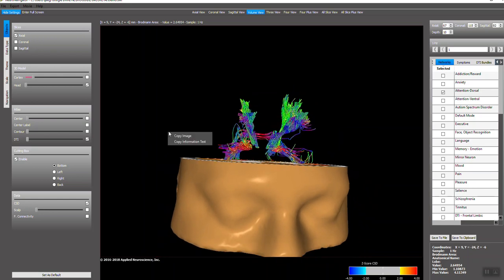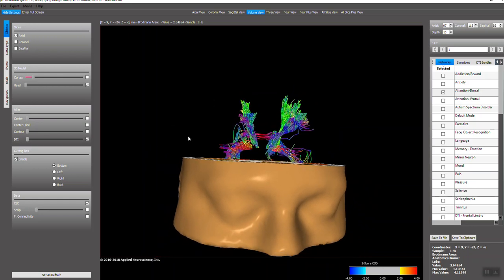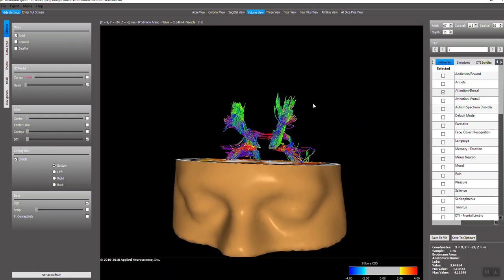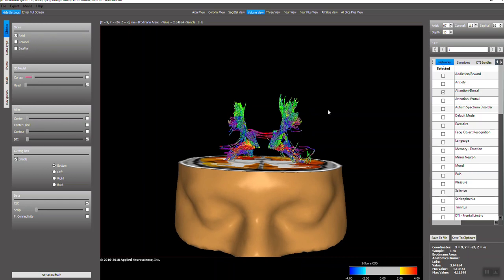And so anyway, this is a quick review of what we'll have in the future in just a few weeks in both real-time Navigator and for assessment. And you can actually use it for biofeedback. We'll be able to evaluate deviations from normal, and you'll be able to then try to reinforce greater stability and efficiency in those hubs and networks that are linked to your patient's symptoms.